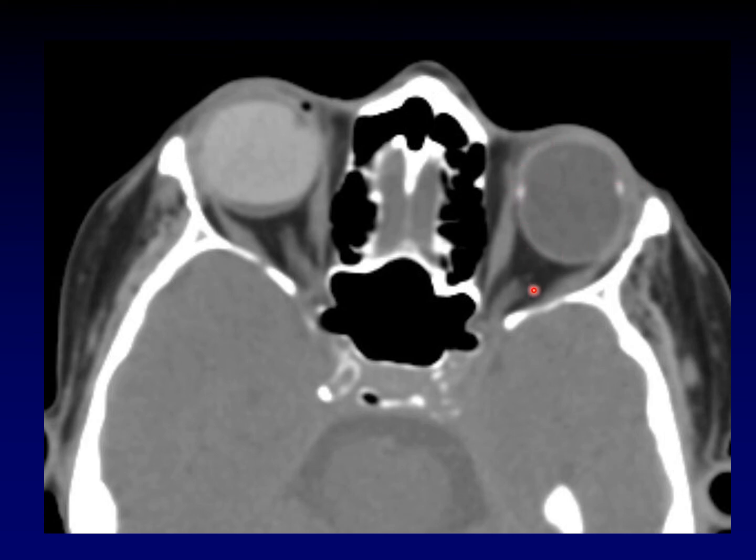The other way you can treat retinal detachment is by injecting material into the vitreous chamber, taking out the normal vitreous humor and injecting, in this case, silicone to try to increase the pressure and tamponade the retina back against the posterior wall. Now, although silicone is transparent, you can see through it, it is radiodense. So it looks, to a radiologist, like, how could anyone ever see out of this eye? But it's just fine. It allows visible light through just fine.